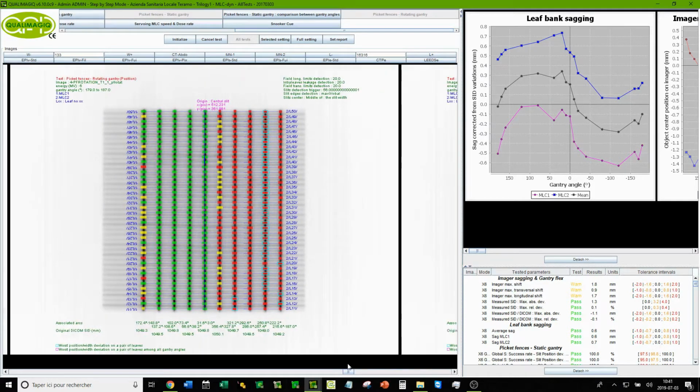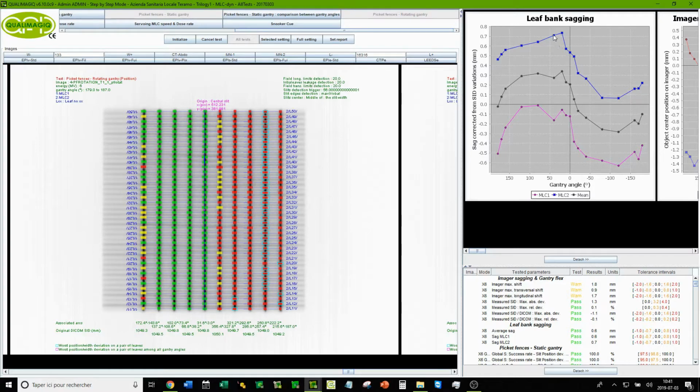Each of the image columns is acquired with a certain gantry angle, and as we know the movement of the imager, we apply to the columns of the image the inverse of the imager's improper movement. That is for the test of slit positions. Lots of problems after gantry 0 degrees, but no problem for the slit width. Why are there problems with the positions?